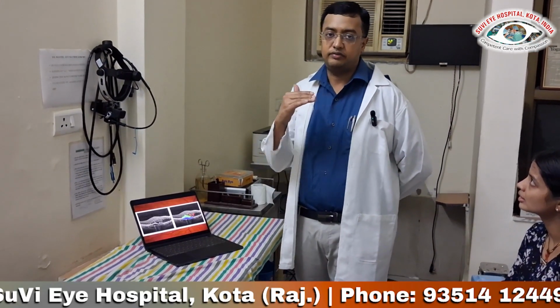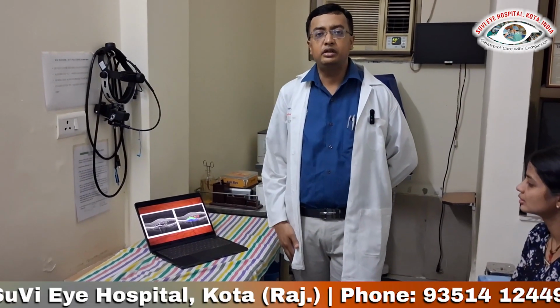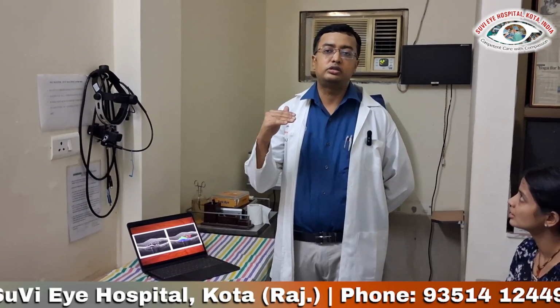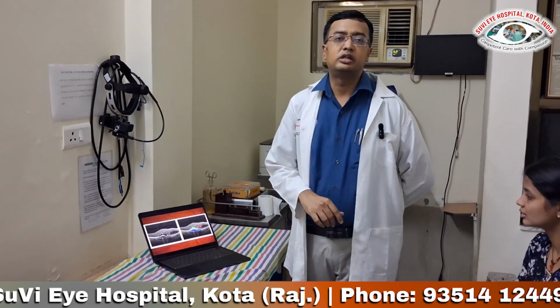And one more biomarker is coming to the integrity of which layer? Our photoreceptor layer integrity. If integrity is lost, if it is disrupted, then the conduction will be disrupted, so the prognosis will be poor. What are there in the photoreceptor layer? There are two zones: one is the ellipsoid zone and one is the interdigitation zone, EZ and IZ. If the integrity of both the bands is lost, then your prognosis is poor.